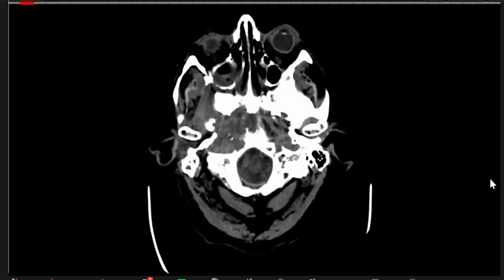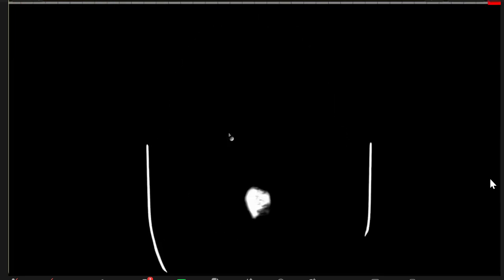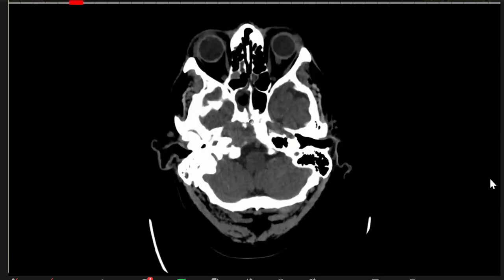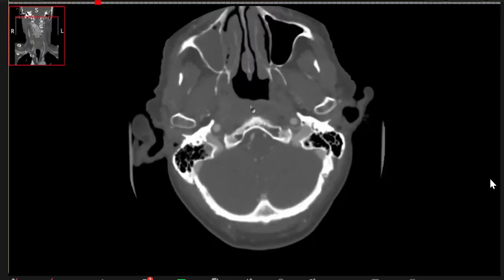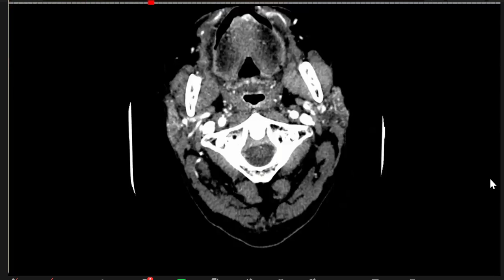So the idea in head and neck is that because of this epicenter, you will say that this is it. If I go into the nasopharynx, I don't see it. But if you say that in my differential, nasopharyngeal carcinoma, I will take it. I will still take it. Having said that, this calcification also goes in favor of chondrosarcoma. Now, on this contrast, actually, this patient was also a stroke patient.